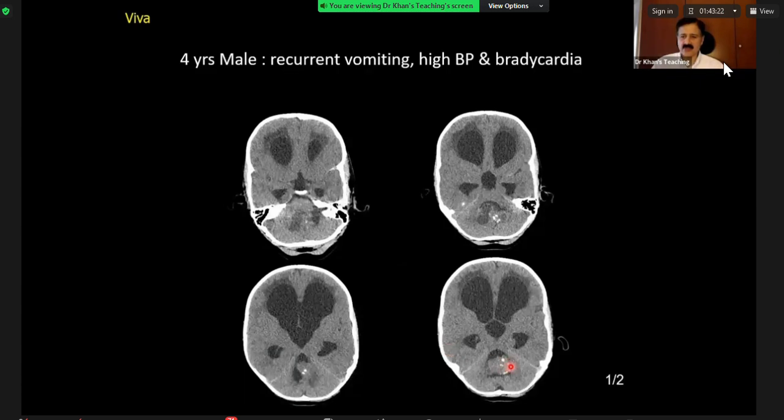Please remember, calcification is most common in ependymoma out of all of these, 50% of them, particularly punctate. And you also pointed out that these tumors have plastic behavior. They might pass into the CP angle through the foramen of Luschka. If you see this on an MR, you will make out what is happening. There is expansion of the foramen of Luschka and the tumor is going into this. That is why it is an ependymoma.